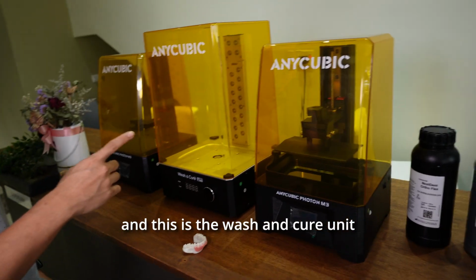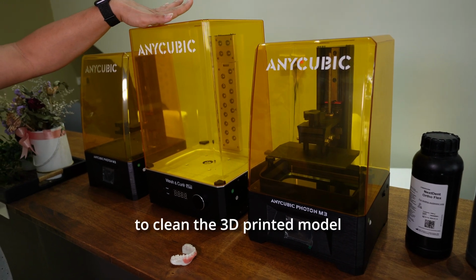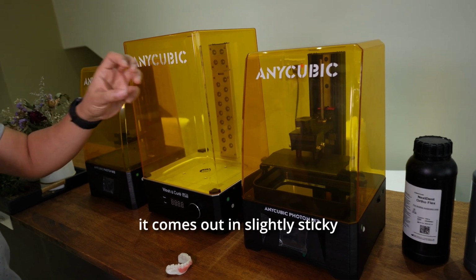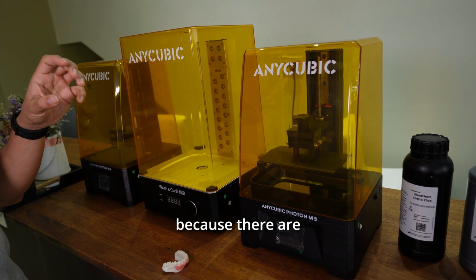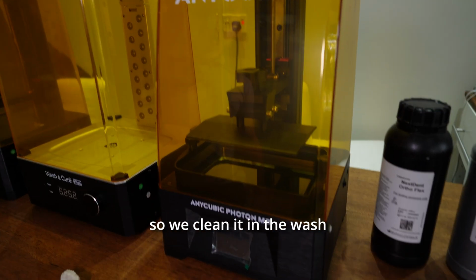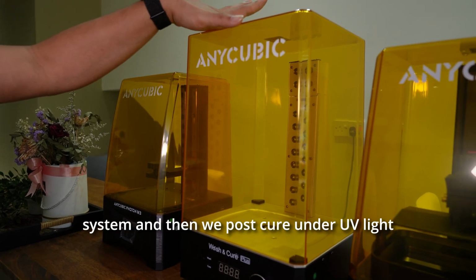And this is the wash and cure unit. The purpose of this is to clean the 3D printed model. Once it comes out of the 3D printer, it is slightly sticky because there is a lot of excess resin, which we need to clean first. So we clean it in the wash system, and then we post cure it under UV light.